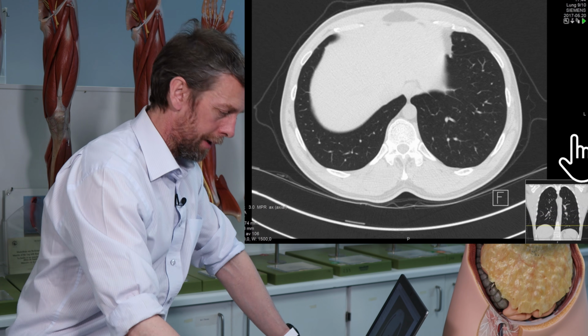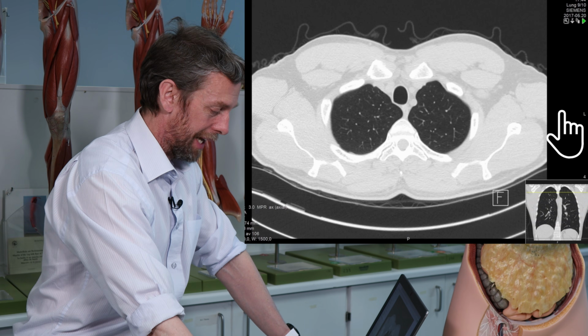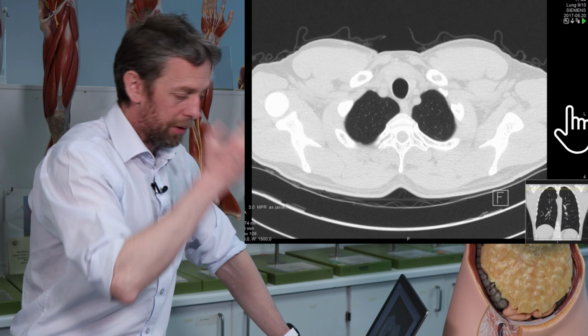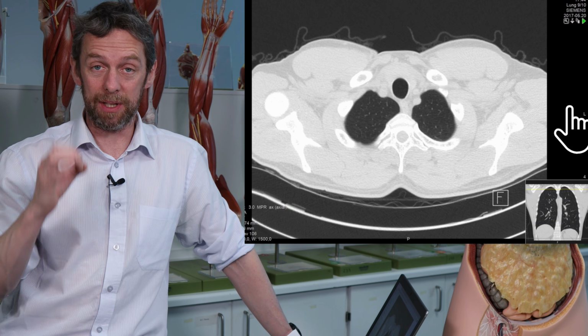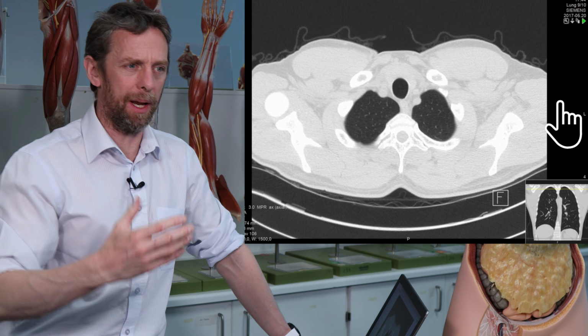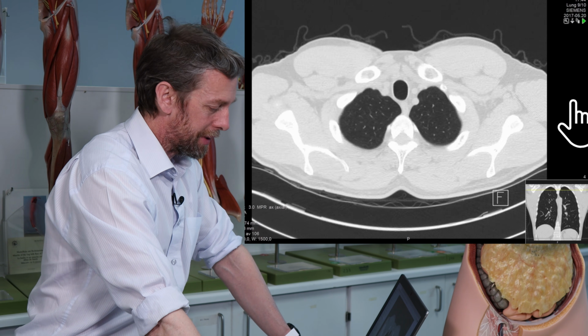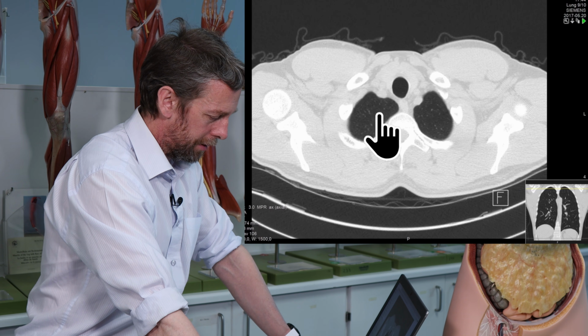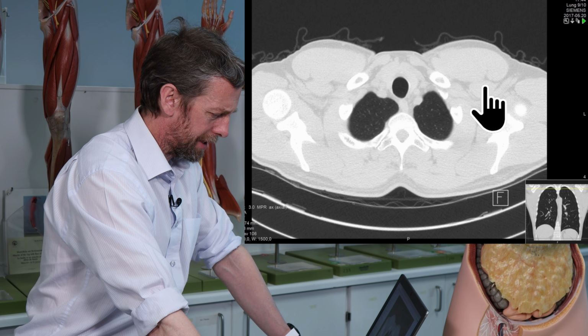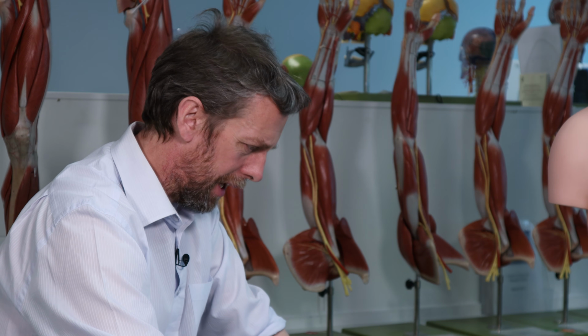So that's the trachea. If I scroll back up again, that's a really good landmark for you, isn't it? And if you're looking at MRI scans, which have more detail, but can look different in terms of levels of grey, depending upon whether they're T1 weighted or T2 weighted or what have you, still look at the lung, look at the trachea. There should be a similar sort of colour. So the trachea, there's a good landmark. Okay, now we can recognise the trachea.